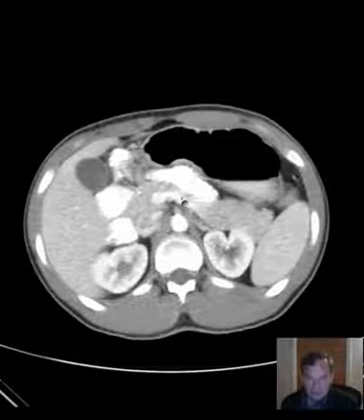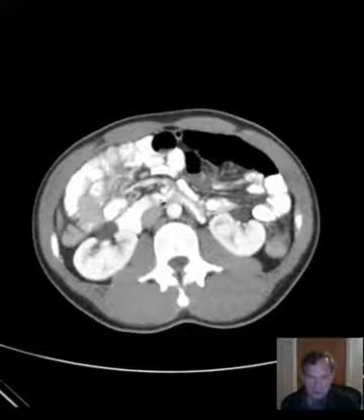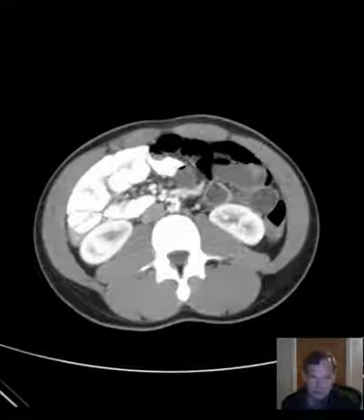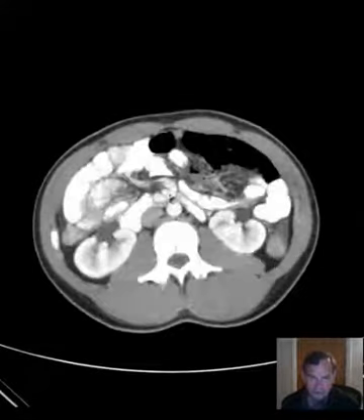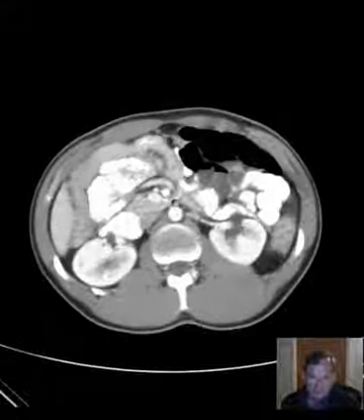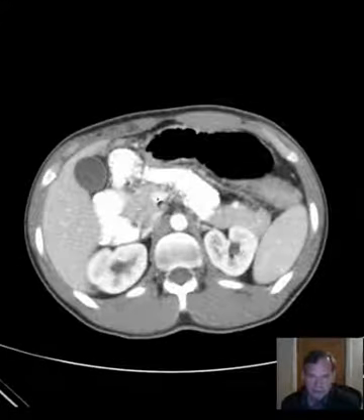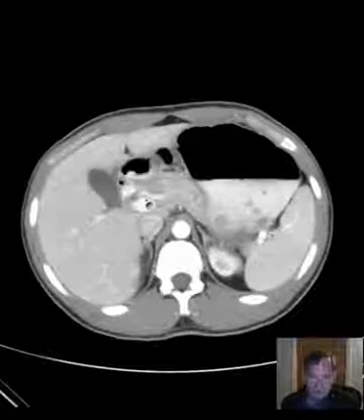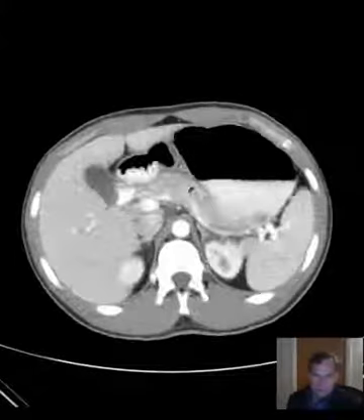And that splenic vein merges with the superior mesenteric vein, which is right here, and that has many tributaries coming from the mesentery. So many of them converge on this superior mesenteric vein, which joins the splenic vein to form the portal vein, which then empties into the liver. So that takes care of the liver, spleen, and pancreas.